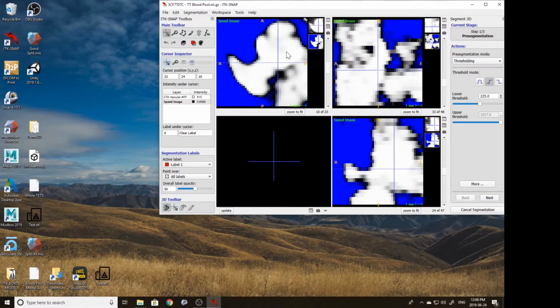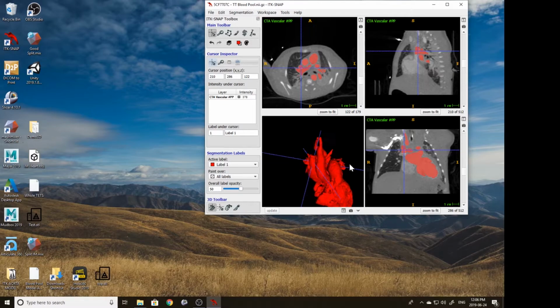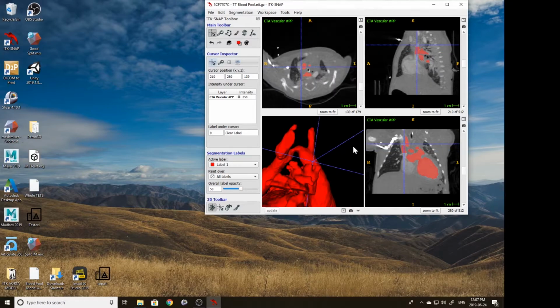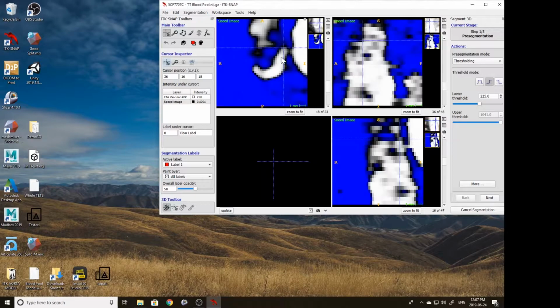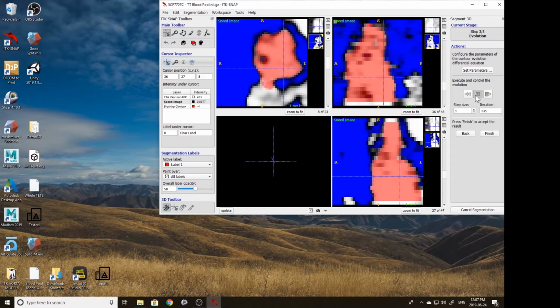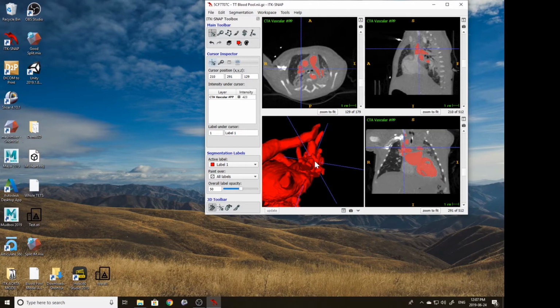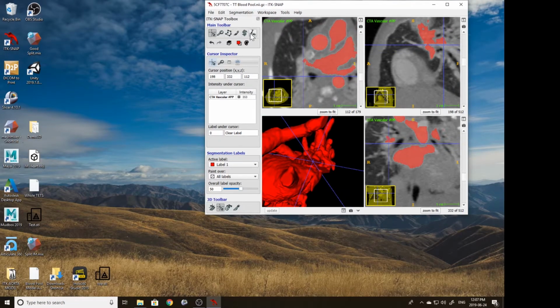Again, I forgot to save before I did the segmentation, especially on small things. I find that sometimes it will freeze on those, so I like to make sure I really do save before that. Again, sometimes you can only do a segmentation when the bubble is somewhere around 1 or bigger. So if you are in an area where it's just not working, every time you hit play, the bubble won't grow. You'll have to do a manual segmentation because of that.